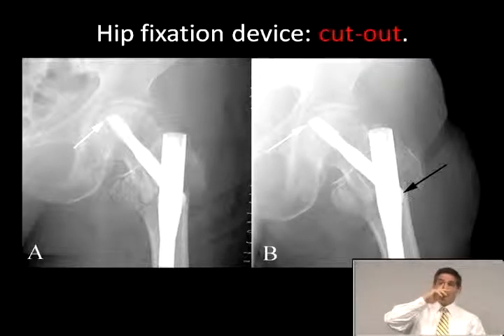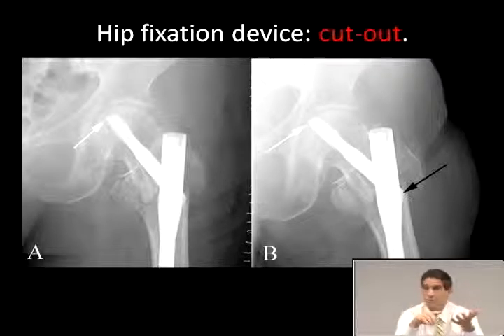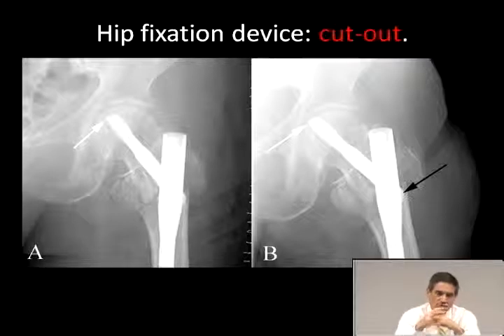But it was not allowed to because it had slipped underneath the cortical margin of the fractured femur. So instead of backing out and allowing the fracture fragments to settle, the screws cut out of the femoral head. And that's not good because once you get inside the joint, you've got those bad things like joint hemorrhage, articular cartilage deformity of the congruent articular cartilage surfaces, and secondary degenerative change, as well as pain. Unusual complication here.